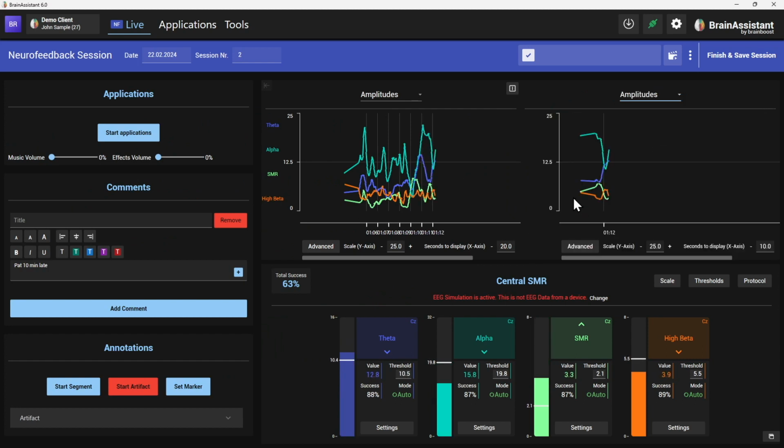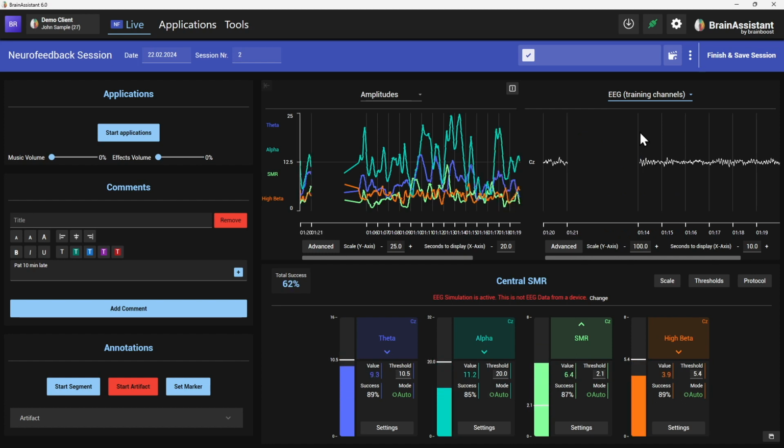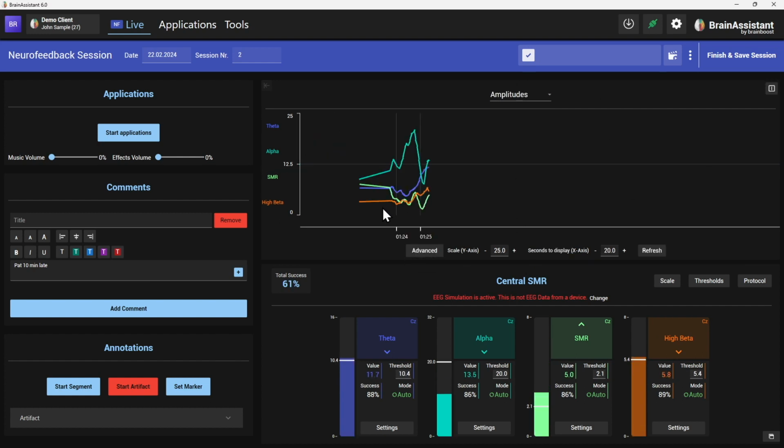Depends on your screen. If you have a Windows computer and use zoom at 125% or 150%, then this might look overwhelming. So I might want to check this one out. But it's a pretty cool function.